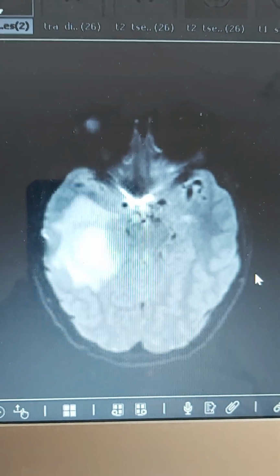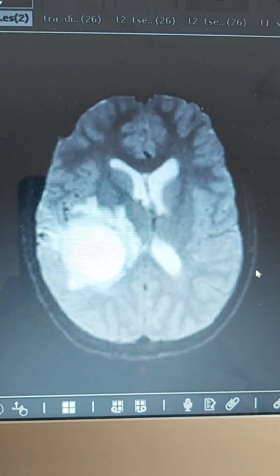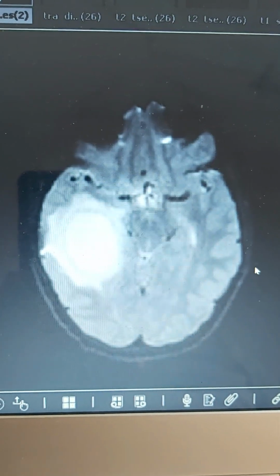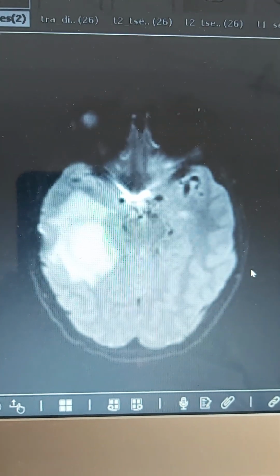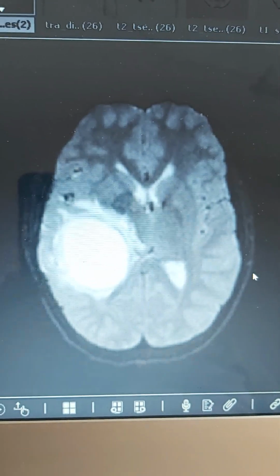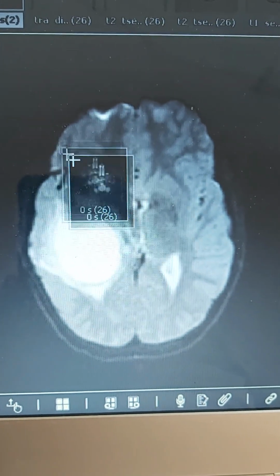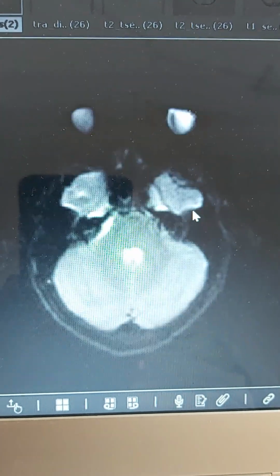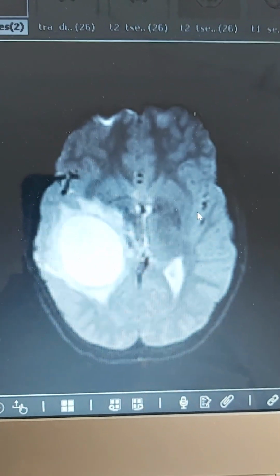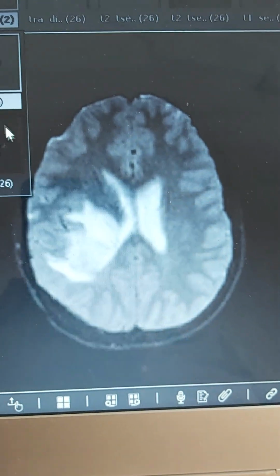This is a recent MRI of a 12-year-old boy who has a previous history of surgical removal of a hydatid cyst 2 years ago. The recent MRI shows a cyst that looks simple, intra-axial, in the deep part of the right parietal region. The fluid inside follows the CSF signal intensity in all the sequences.